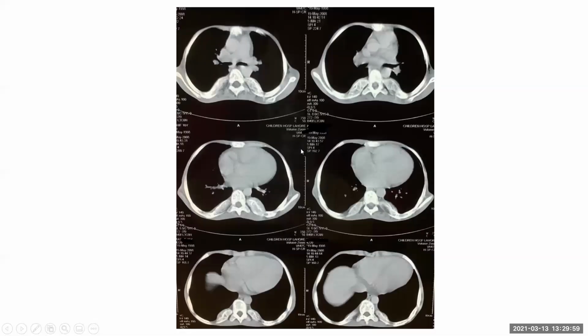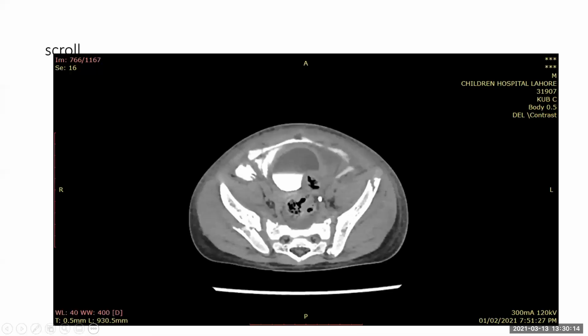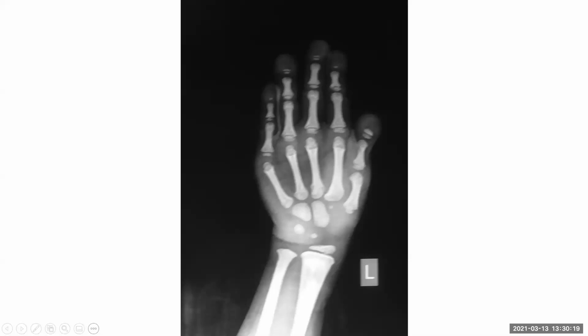And of course, this was thalassemia with extramedullary hematopoiesis. And this is the Erlenmeyer flask deformity of the humeri. And you can see the bone has an infiltrative, permeative pattern of abnormality, the hair-on-end appearance. And this was the... Okay, this is another case.